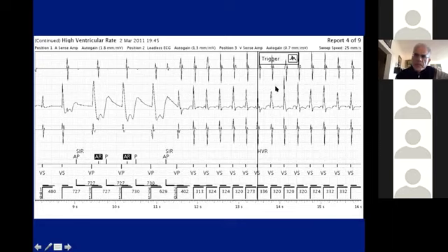So this is one-to-one tachycardia where we need to decide whether it's ventricular tachycardia or SVT. Morphology, if we compare it to sinus rhythm, looks kind of similar, maybe a little different. It's definitely different from ventricular pacing, right? So ventricular pacing is drastically different. Arrhythmia probably starts with this.